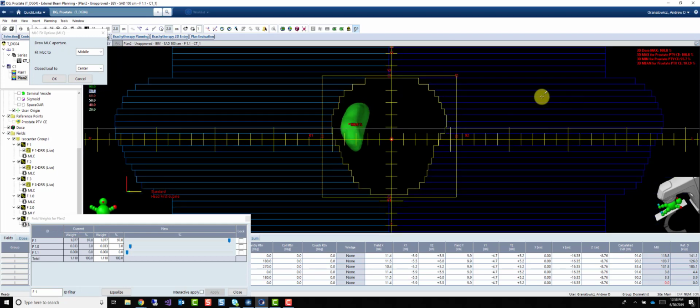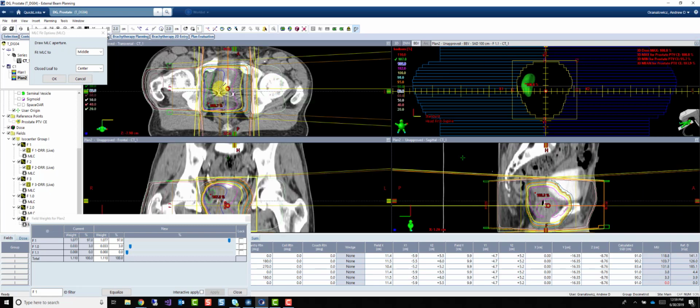So something I want to point out is by turning this isodose line to segment in 3D, it gives you a little bit of depth perception. So if you look at this line right here, this shadow, that's telling us that this part of this volume is closer to us, or closer to the AP side, and then this part is farther away. So if we come look here, this shadow right here that seems to cut through that volume is showing us this edge right here, and then this back portion right here is showing us this edge right here.